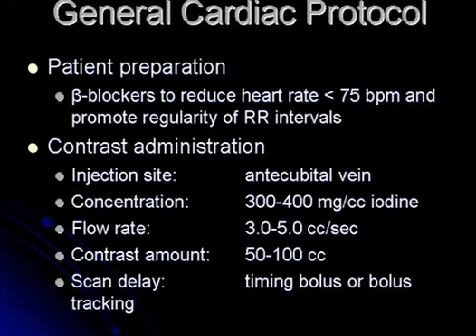In general, we do like to give contrast so that we can visualize the ventricular chambers as well as distinguish the walls of the heart. And depending upon the area of interest, the amount of contrast and timing of the contrast will be varied.